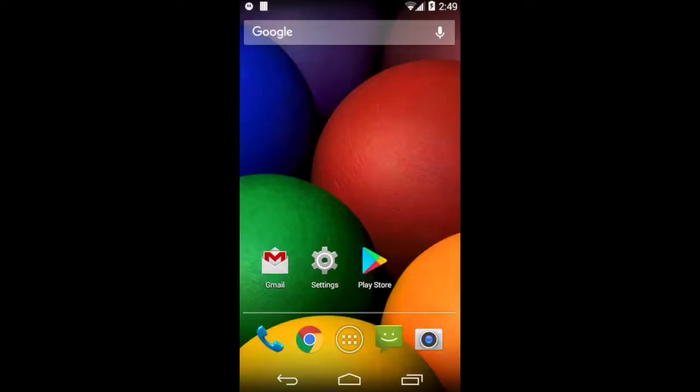Hello, today I will be showing you how to install and troubleshoot HeartMApp. To begin, you must have an Android smartphone with a version 4.4 or higher to download the mobile app.